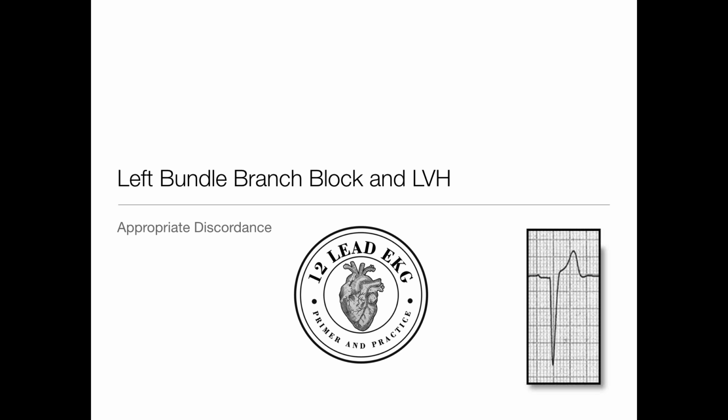All right, well, let's go through some additional causes of ST elevation that we didn't get to in part 1. So left bundle branch block and left ventricular hypertrophy. You probably remember this from some previous lectures in class where we talked about, well, there's the dog.